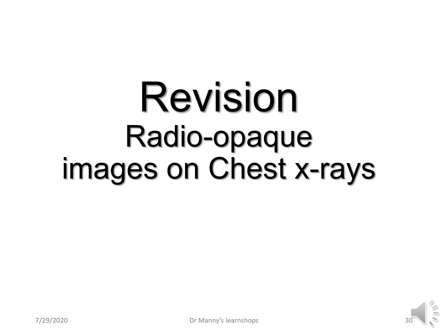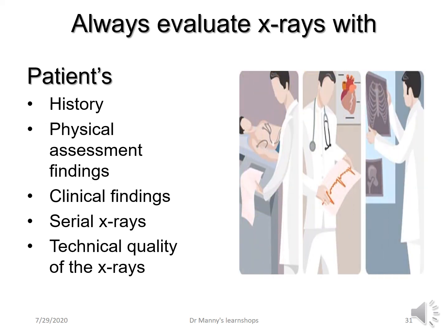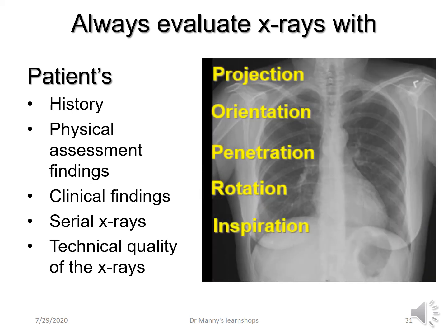So let's review. Always remember to evaluate the patient's X-rays with their history, their physical assessment findings, the clinical findings, serial X-rays, and remember the technical quality of the X-rays: projection, orientation, penetration, rotation, and inspiration.